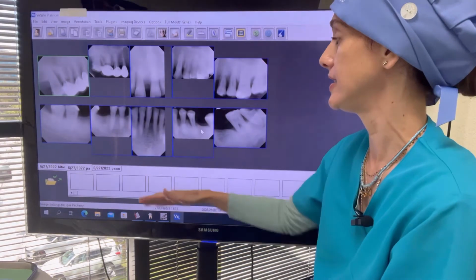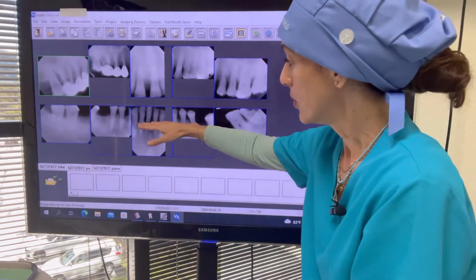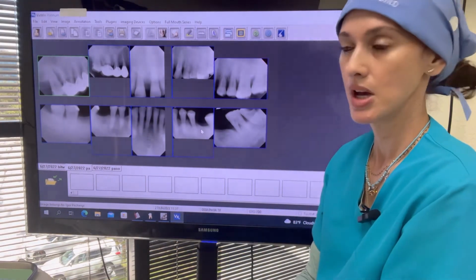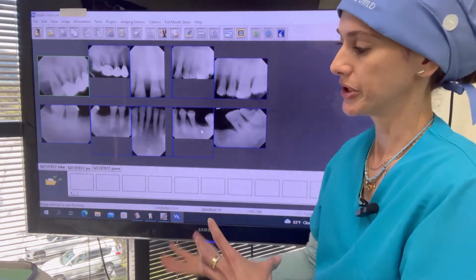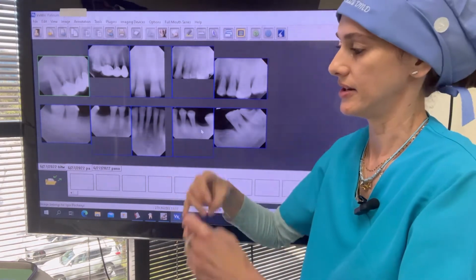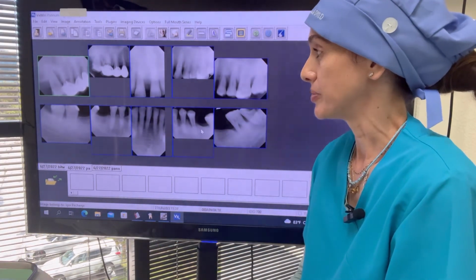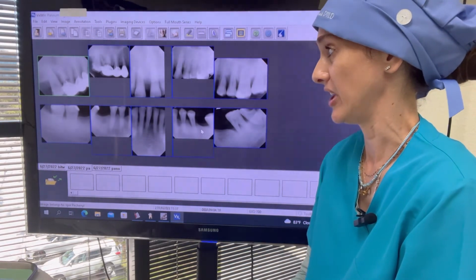Very important, because if you let this proceed, what's going to happen? The bone loss is going to be so big, so large, that the teeth are going to start coming out by themselves. And they're going to have abscesses everywhere, because when you don't have the bone support, the bacteria will enter through the gum and infect it, and then you just need to take them out and go to dentures. Basically it will be dentures, because if it's such an unhealthy environment, I wouldn't recommend any other thing.